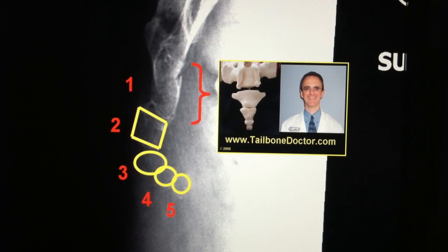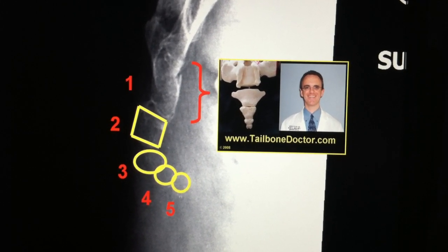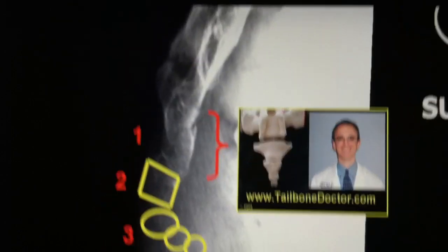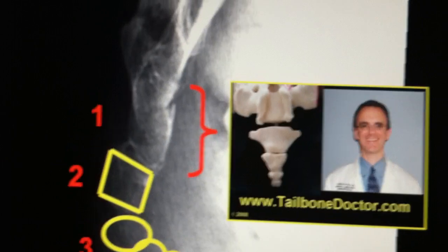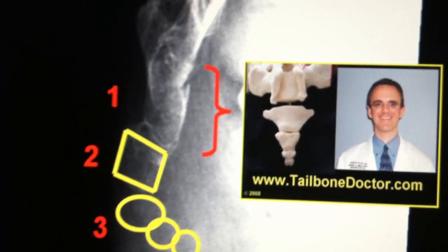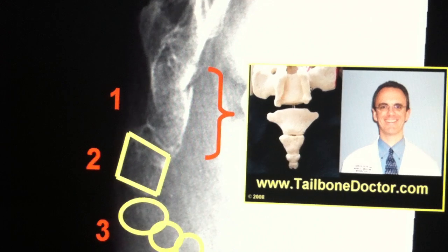But as I come up here to coccygeal bone number 1 in this particular patient, as I try to draw the outline, first of all, let me try honing in a little closer here, and let me see if I can focus out a little better on that portion.